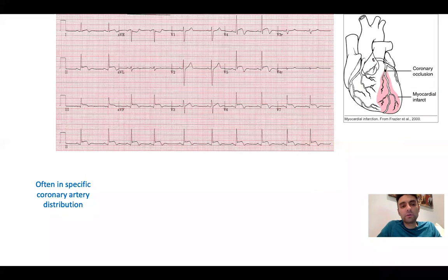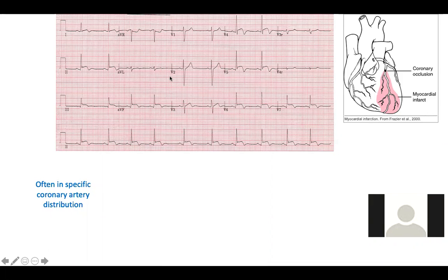So for example here, you guys tell me, do you think this is a pathological or non-pathological ST segment change? Pathological. Yes. So you have ST segment elevation with a T wave that is inverted, funny looking. ST segment elevation, T wave that's inverted. So discordance between the ST and T wave, that's very significant.